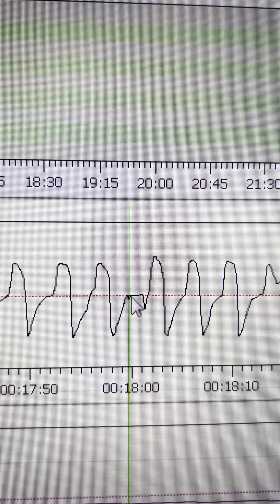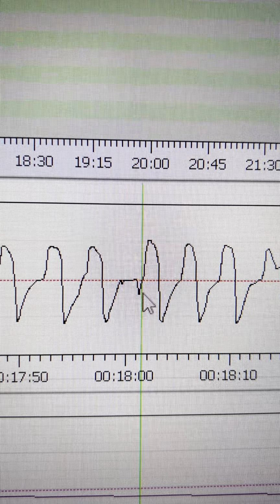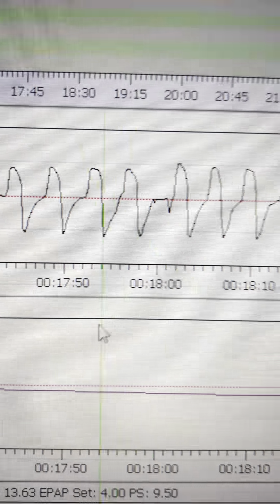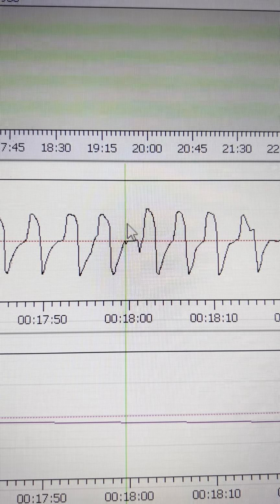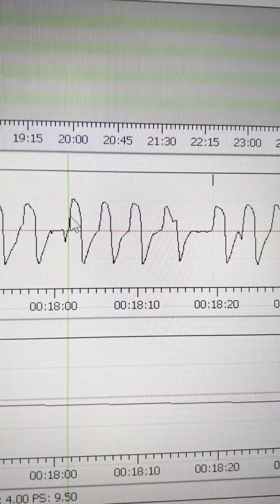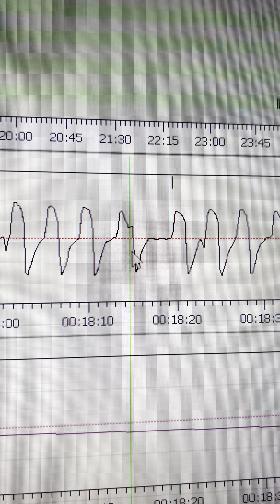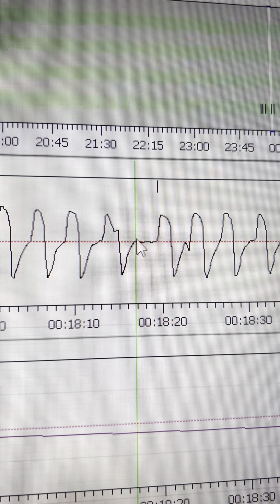So I basically stop breathing for a bit, and then I try to exhale a bit more again and try to breathe in. And here you can see a slight recovery in a way, or a momentum spike. I'm not sure what to call it, but this breath is bigger than this one right here, which most likely means that this part wasn't central at all. And then here you see further what could be happening if my tongue was already trying to choke me. Well, here it gets cut off. You can see a similar pattern right here a bit. Boom, I try to inhale, you can't.